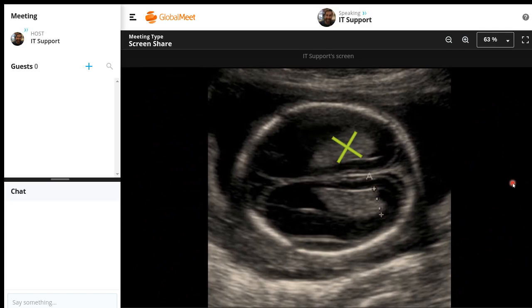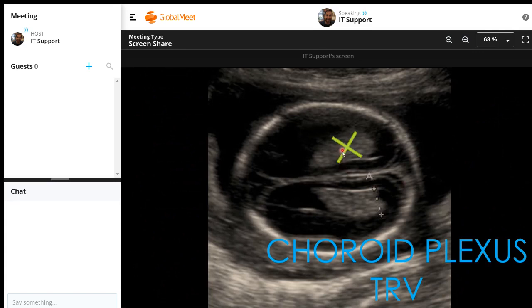This echogenic teardrop shape here is the choroid plexus, in a transverse view of the head again. We can see that both of them bilaterally are filling that ventricle. So that's where we want to see them. It's nice and echogenic and homogeneous, which is the look we want when we're looking at the choroid plexus.